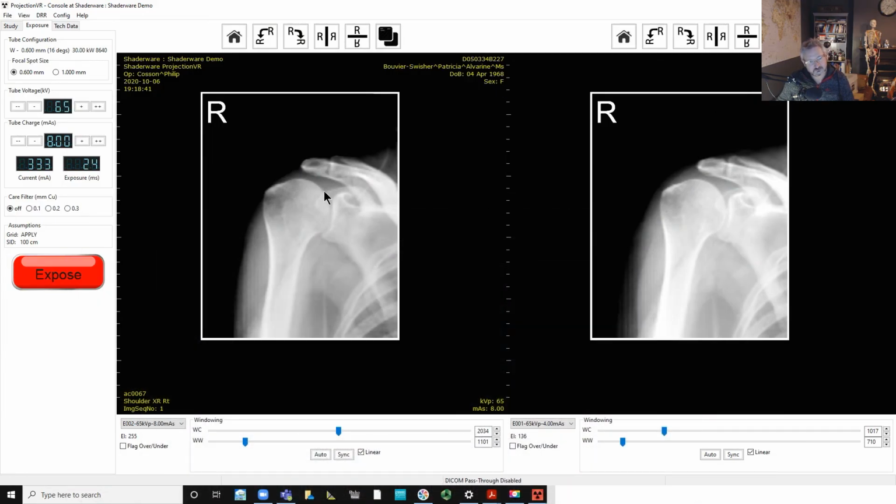Although I'd have to say that this doesn't look as smooth as it could. Anyway, we've got the information for the experts to have a look at, and I'm sure the orthopedic surgeon has seen more of these than I have. So I'm happy that this gives him or her the information needed, and we'll discharge our patient again.